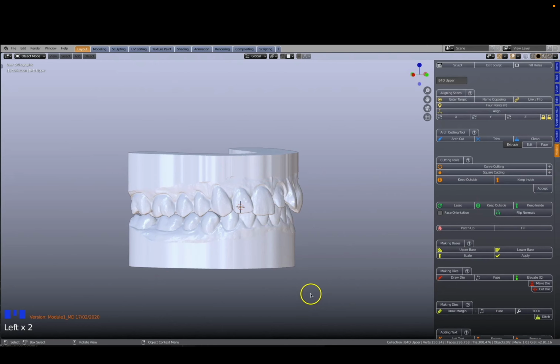Sometimes when using a Boolean cut in CAD software, the normals in an object can get switched around. A normal is best described as the outside surface of the mesh. If the normals get switched around, this means that the mesh is turned inside out. You may notice subtle changes in the surface color and shading of your model.